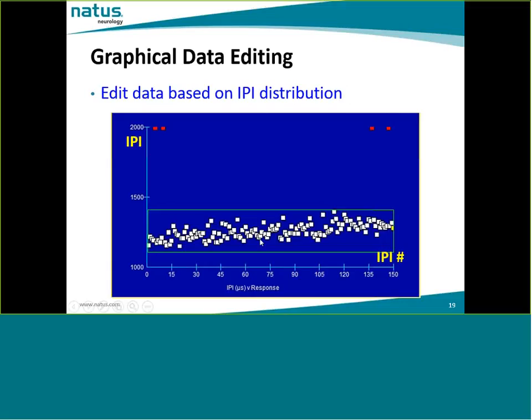And this distribution is extremely useful to assess the quality of the data and also some of the other information about jitter. For example, we can see the interpotential interval values are a little bit low over here and they're a little bit high over here. So perhaps there is a trend in this recording. You can readily appreciate the power of this plot. Just to demonstrate the concordance between the waveforms and this plot, let's look at some jitter analysis.